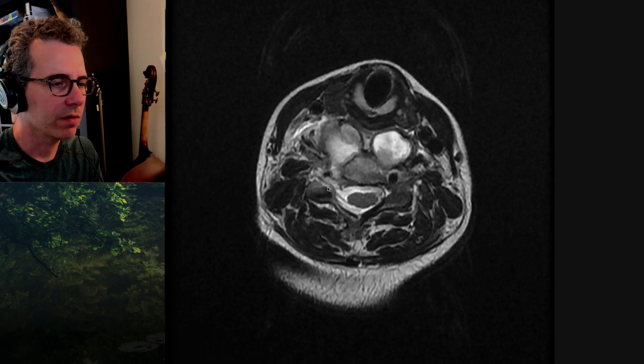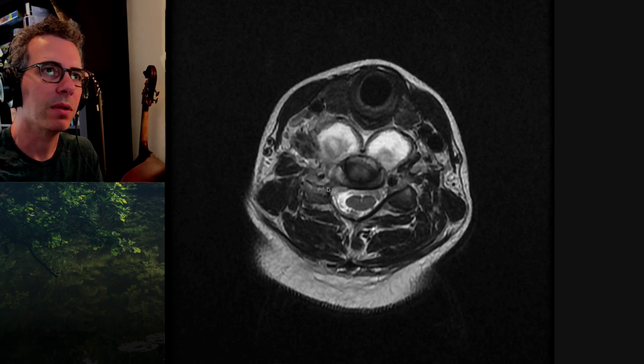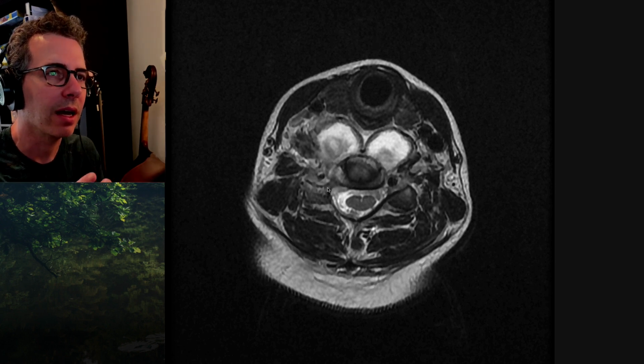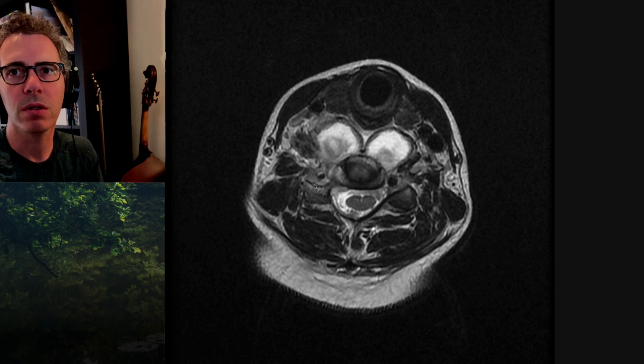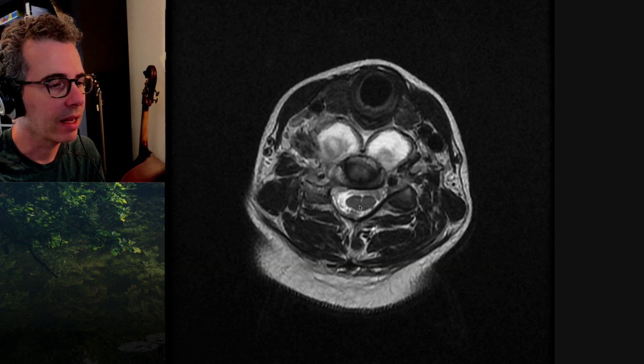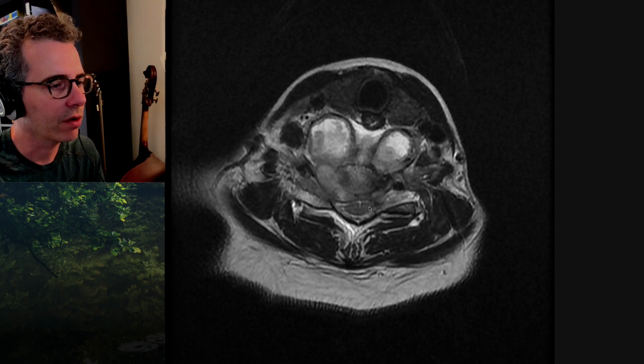So you can have a little bit of a sulcus going down anteriorly. And so if you happen to have relatively thin slices on sagittal, and one of them lands perfectly in that midline sulcus, anterior spinal, I don't know what it's called, then you might get that anterior signal, which is anterior to the central canal of the cord.